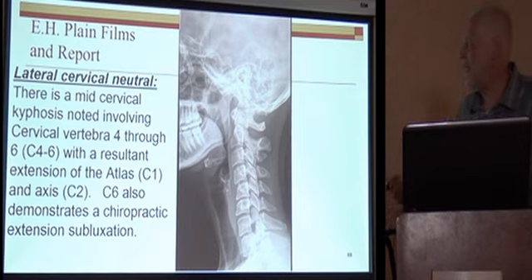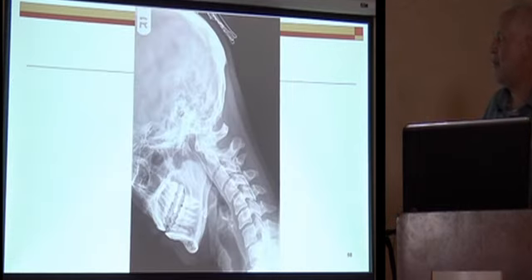So essentially I'm saying that this atlas looks to me like it's back, like it should be a little bit more horizontal, and it still has a little bit of an angle, and you'll see it more in the balance of the films. So here she is with flexion. Almost missed this shot. Almost didn't get C7.